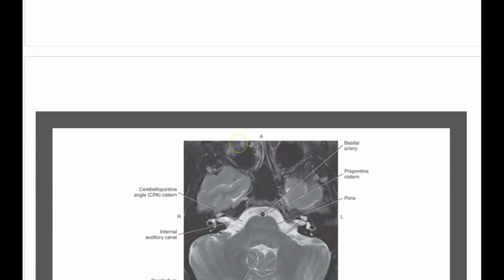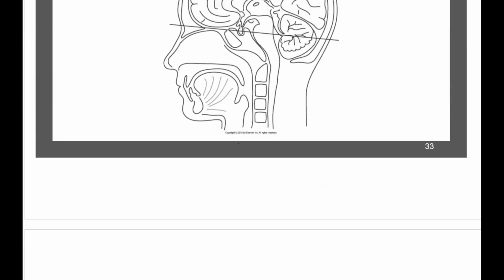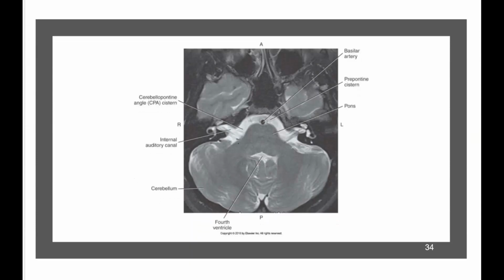And looking here, we're a little bit lower, so we're down into the pituitary gland. Should be at least. Oh, they're giving us an IAC, so we're cutting through the middle ear. So let's take a look here. So if we start, we have the basilar artery, so right here. So this is the inner ear. So these are on both sides the inner ear. So that's the right inner ear, and this is the left. We call them IACs.